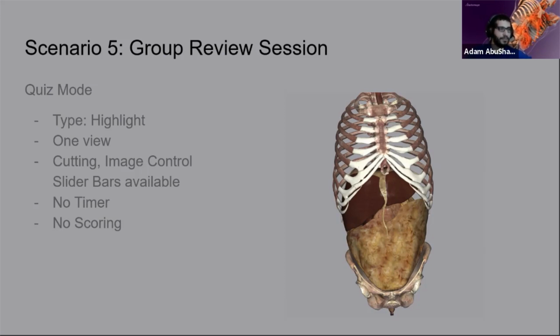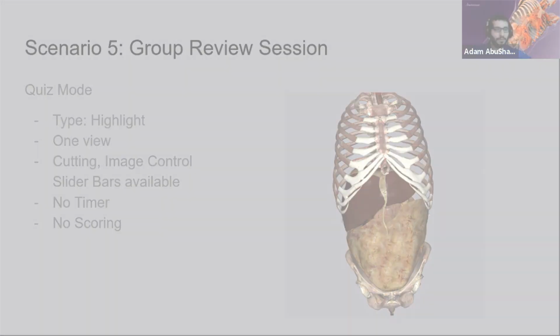So those are 5 scenarios I've come up with and put in this slide deck. I'm very certain that you can collaborate with other teachers to come up with other scenarios, and that different ways of assessment have been provided throughout UGM as well. And now I'll go ahead and recreate those steps using the Table software.